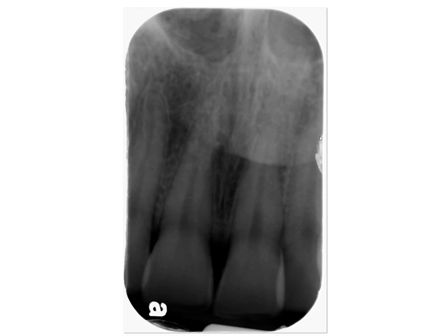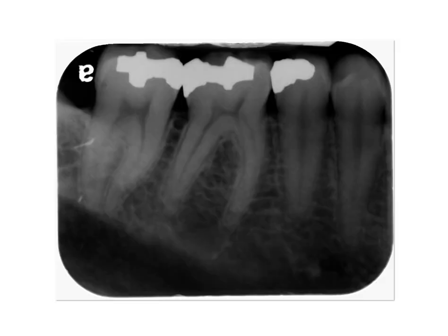So soft tissue of the nose, again, I hope you've seen this enough. Nasal aperture, nasal septum, and this is the area of anterior nasal spine. You can see the intermaxillary suture. And again, a very great example of submandibular gland fossa, internal oblique ridge. And this would be the anterior aspect of the external oblique ridge.